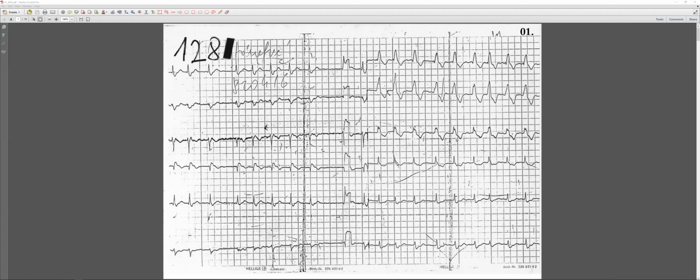Okay. I'm kind of blanking out right now. And the R wave, especially among the QRS complex, is not normal, and there is ST segment depression. Now, first, let's concentrate on the QRS.